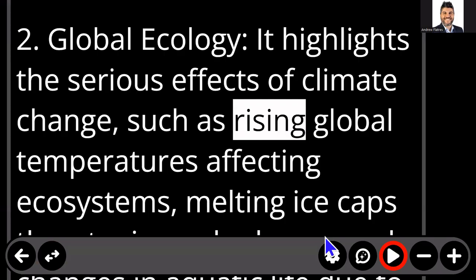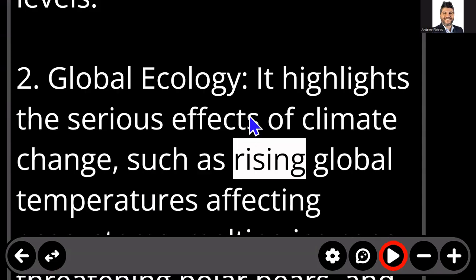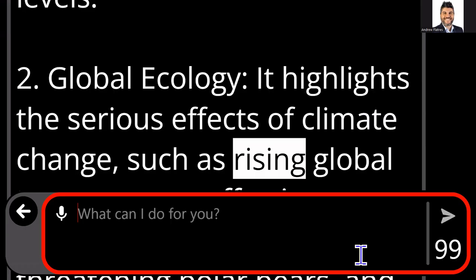So we now have the ability to point and click and start and stop reading anywhere within the chat as we're looking at a chat. So this again is new in version 1.5. So let's say that after looking at the image again, I had another question. I see my AI assistant call out down in the toolbar, fourth from the bottom right. It's got the 3 stars in it. So I click there and a chat dialog opens.